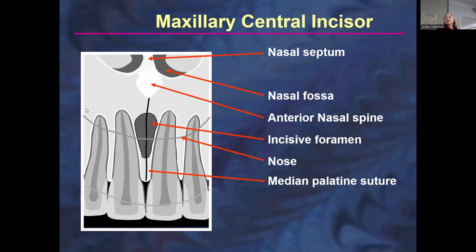Other things that you can see are the soft tissue outline of the nose and the soft tissue outline of the lips. If it's lower, like across the teeth, it's probably the lip. If it's a little higher up and it's across maybe the roots, it's probably the nose. So you can just think about it anatomically, the way it shows up. Sometimes you can't see it at all. On the exam, I'm going to show you a picture where you can see it.